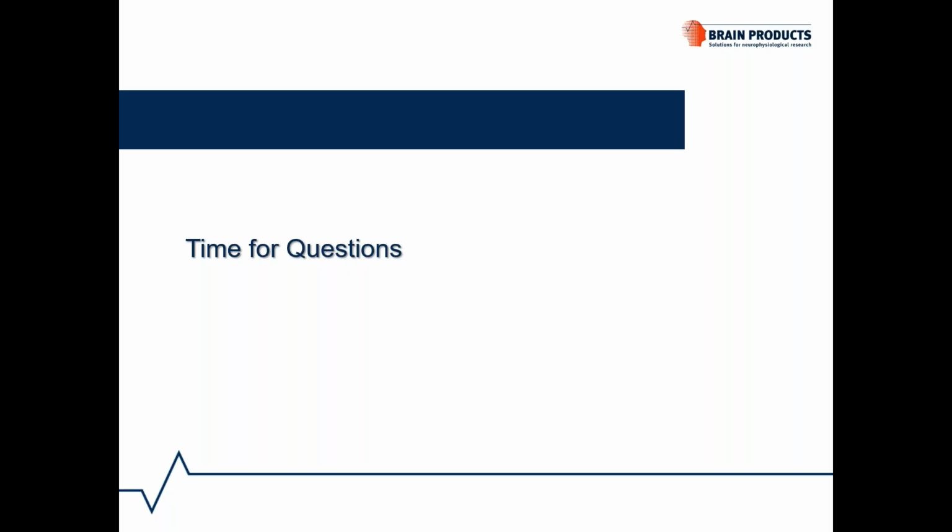Okay, so here we have one. So you mentioned that coherency can be based on FFT data. Can you show how to do this in Analyzer? That's a very good question, and yes, I can show you that.